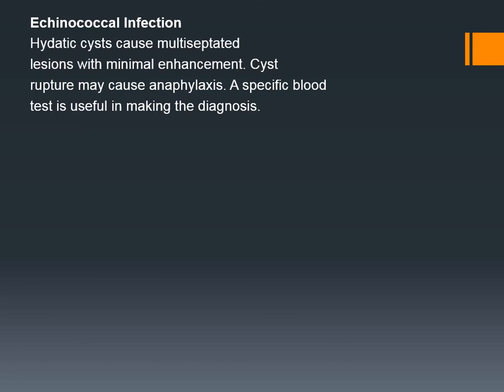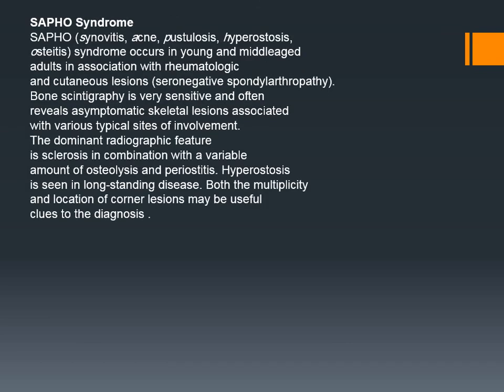Echinococcal infection. Hydatid cysts cause multiseptated lesions with minimal enhancement. Cyst rupture may cause anaphylaxis. A specific blood test is useful in making the diagnosis.